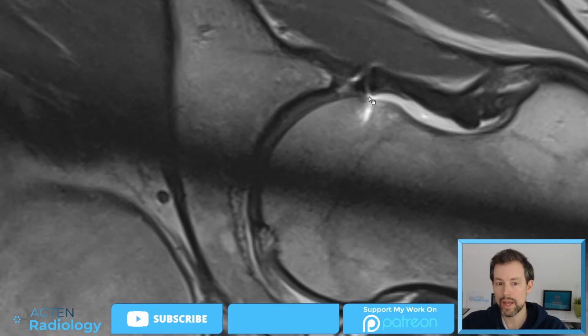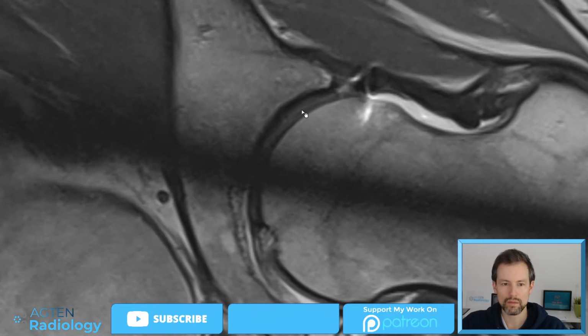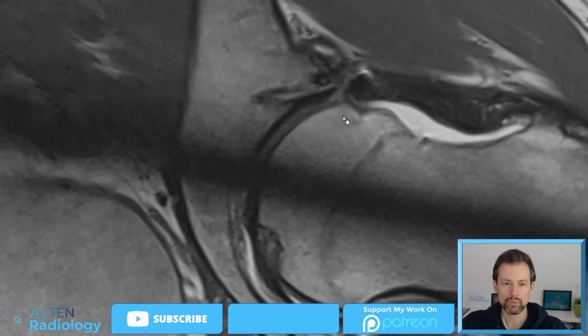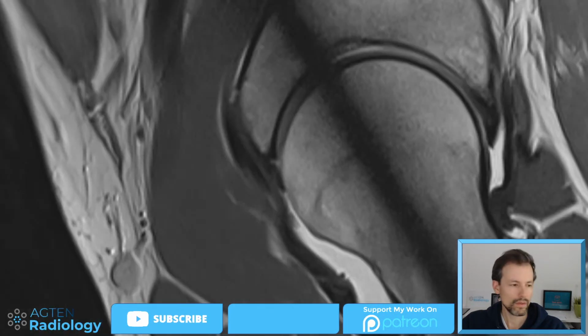Certainly we don't see any fluid undermining the cartilage, no delamination, also no very obvious black line that would indicate a closed delamination of the acetabular cartilage. So I think we can agree with this finding.